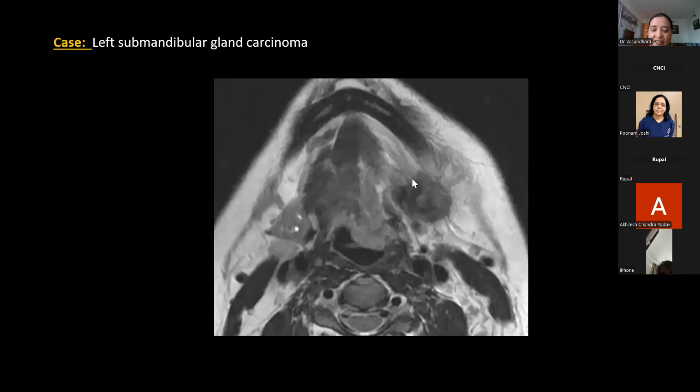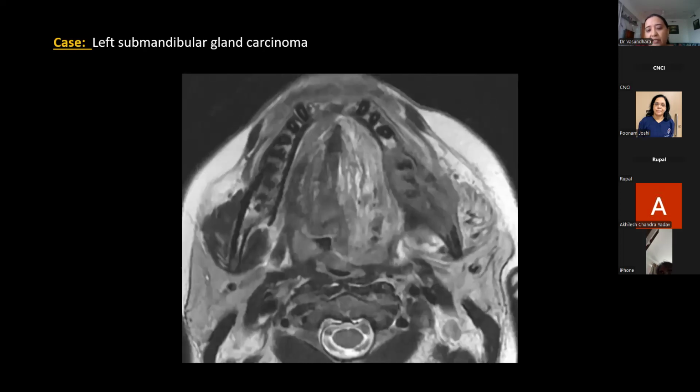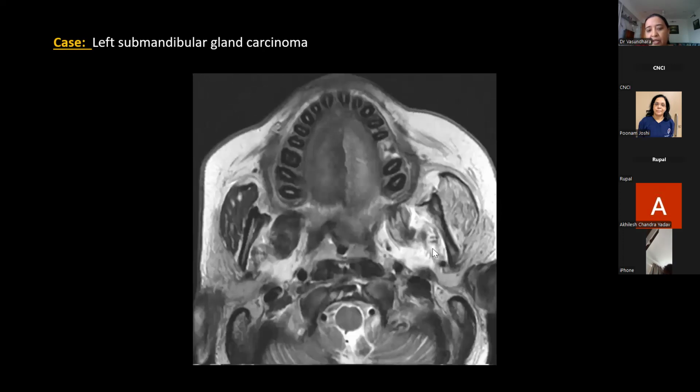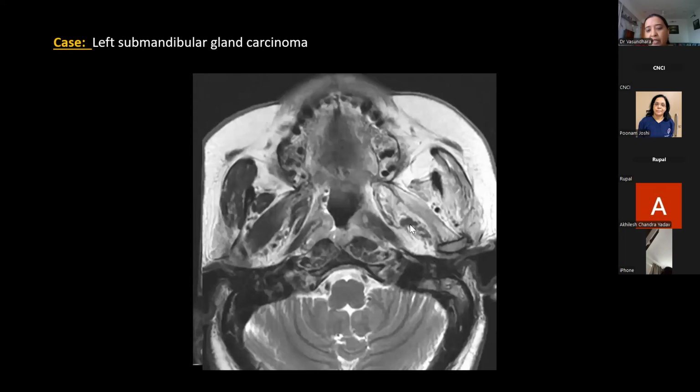Now, perineural spread in these cases is very, very rare, but I found a very interesting case. This was a tumor of the submandibular gland, which was treated with RT and later recurred and involved the mandible. Looking at this, there was some structure. There was a palsy of the hypoglossal. There was a tongue palsy over here, and the muscles of mastication had atrophied. Some structure was coming over here apart from the inferior alveolar nerve and joining this nerve to form a thickened perineural over here.